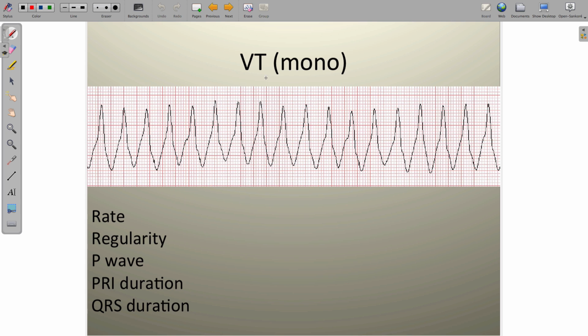So this is ventricular tachycardia. Ventricular tachycardia comes in two flavors, a monomorphic, all right, mono, one. Morph means shape, so monomorphic means one shape. If you look at the peaks to the troughs here, they're pretty much all the same shape. Now, there's a little bit of movement in the baseline, and that's what gives it an appearance of different amplitudes. But the amplitude, I assure you, if you measure them across here, they're all exactly the same. So one amplitude or one shape, ventricular tachycardia.